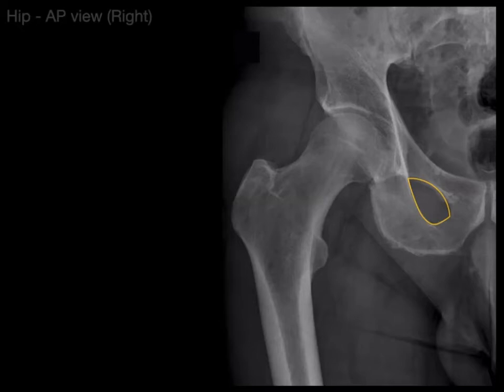This opening or hole right there is called the obturator foramen. Obturator means stopped up, because a membrane closes most of it, except for a little opening at the top where the obturator nerve, artery, and vein come out. The obturator foramen is a very characteristic opening, and it sounds like operator, but it's not. Then we have this structure that is the greater sciatic notch.